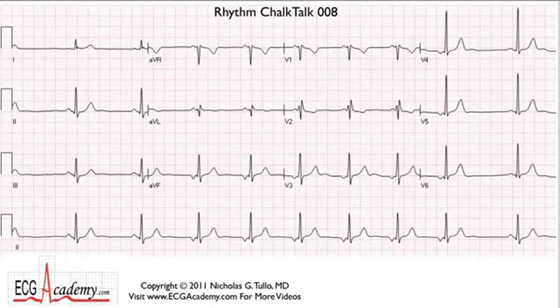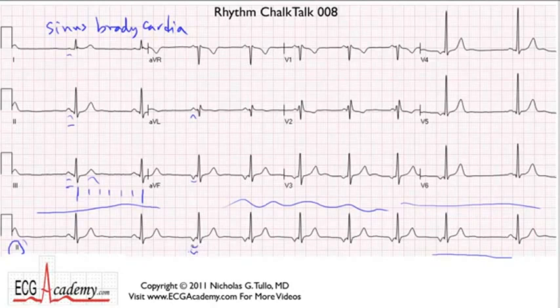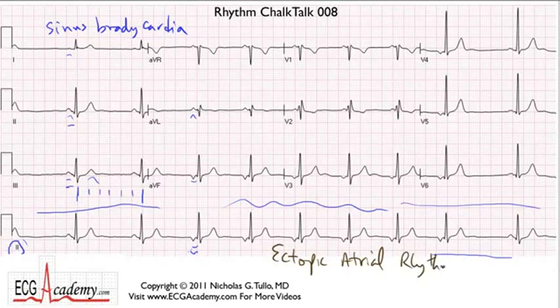Well, let's go back to this and see what we're talking about. So you have this, by definition, an ectopic atrial rhythm that is a little bit faster than the sinus bradycardia that's here. The P wave changes because the axis of the P wave is headed up and towards the right, but it's also positive in AVL, so that's why I think it's coming from the right atrium, since it's going towards AVL as well as towards AVR. So you have this ectopic atrial rhythm that has a little bit of a warm-up, because it starts out slow and then builds up a little bit.